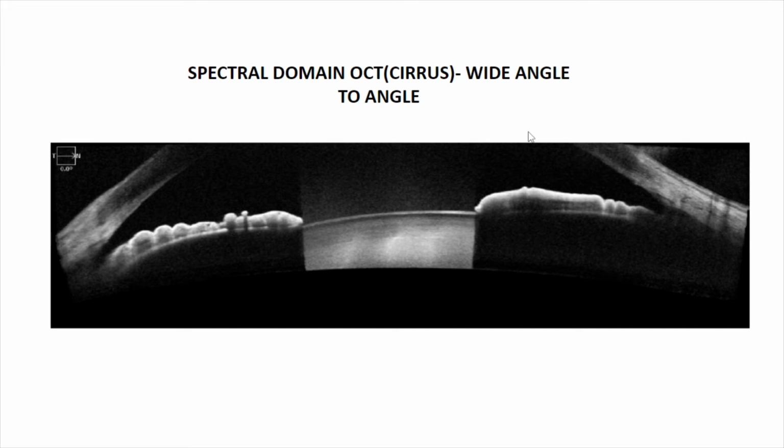Anybody can say which machine this is from? Go ahead, you tell. So this is Cirrus OCT. Oh, Cirrus. Okay. Sorry, I didn't see that. Okay, continue.